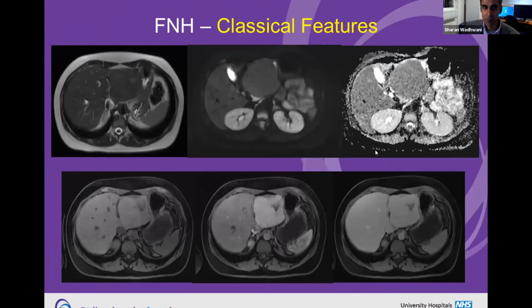Going through the other common lesion, you'd be forgiven for thinking that this MR slice here doesn't really show anything. But actually, you can tell there's something there because the lesion is big, it occupies the left lobe. The architecture is different. The branching vessels and ducts that you see in the right lobe, you don't see in this section, and it looks very rounded. Interesting again, though, that on the diffusion it's the same signal. Again, on the ADC, the same signal. That suggests to me that this is hepatocellular in origin, and that's a real good marker for something that comes from the liver itself.